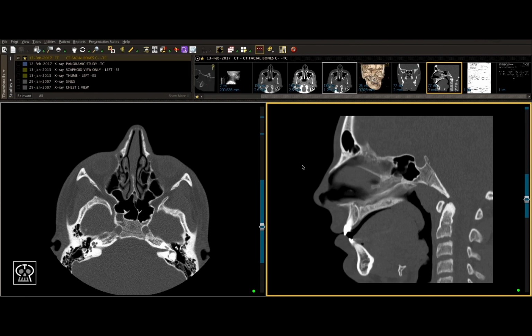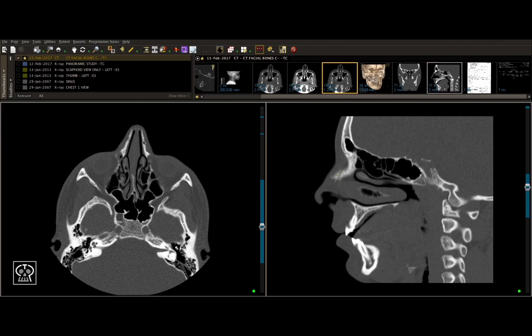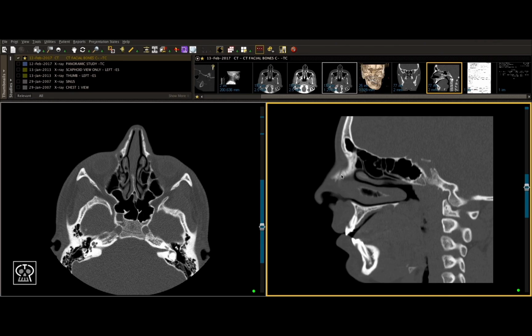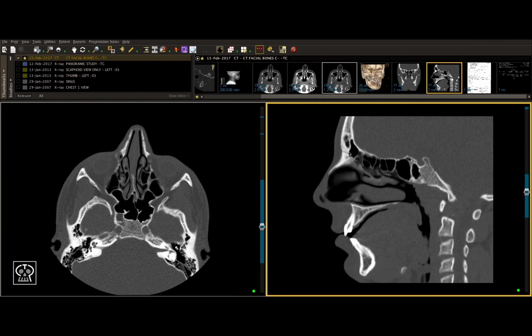Finally, our sagittal view. It does give us a chance to explore these suture lines again and show you how easy it is to confuse them for fractures. Here we see an example on the left side, and this is between our nasal bone and the frontal process of our maxilla, and this is just a normal suture line. In addition, superiorly, you can see the nasofrontal suture between the nasal bone and the frontal bone, and once again, this is just a normal suture line.